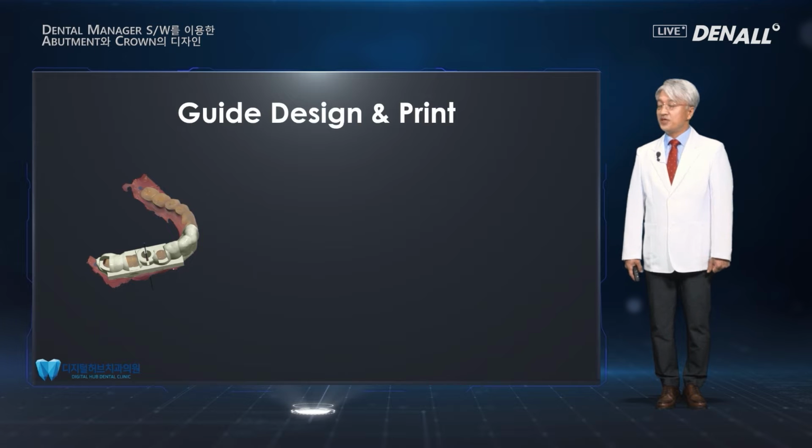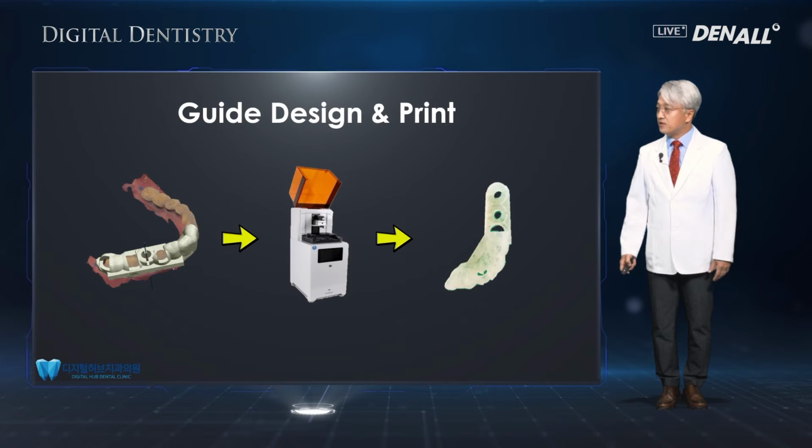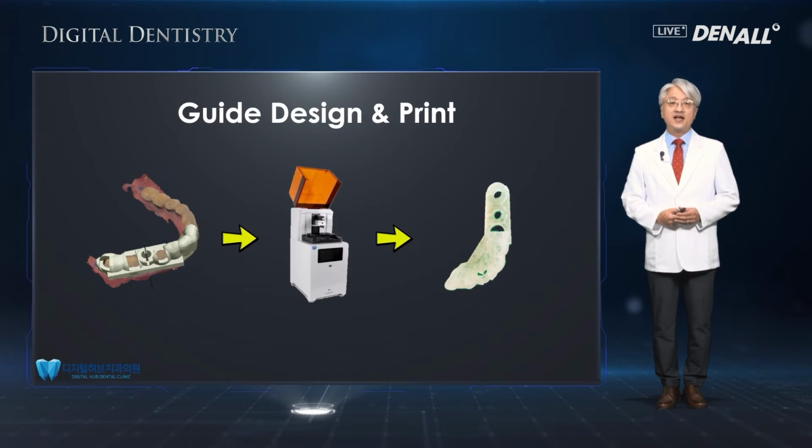If you look at the guided design and print, as you can see here, a precise surgical guide can be designed after implant positions are determined. Using a 3D printer, the guide can be printed before surgery.